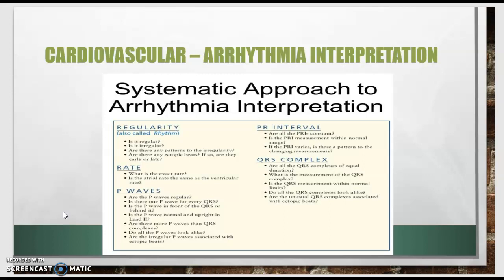So you're going to be eyeballing it a lot, where you can mark on a piece of paper to march out to see if it's regular. But is your rhythm regular? So does your QRS complex come at the same time every time? Okay, do they what we call march out? Is your rhythm regular?